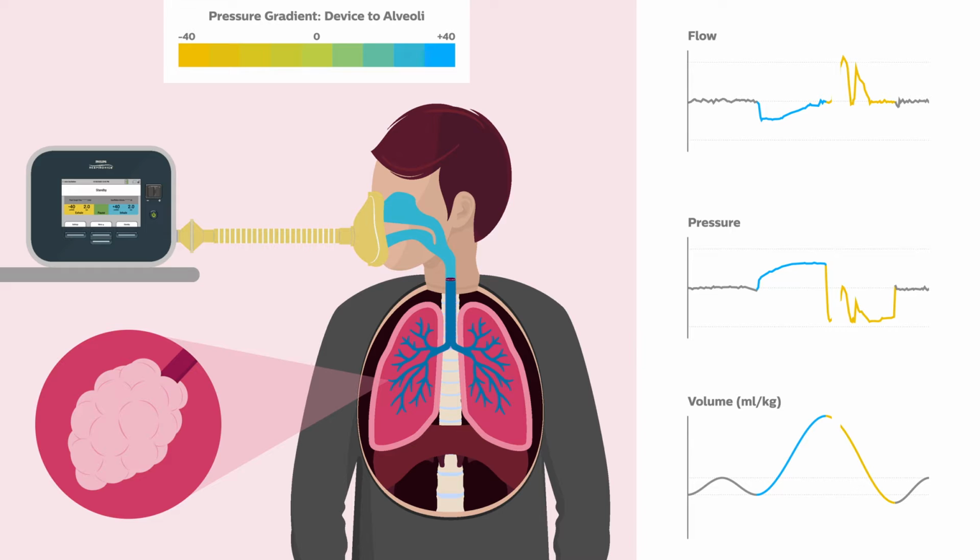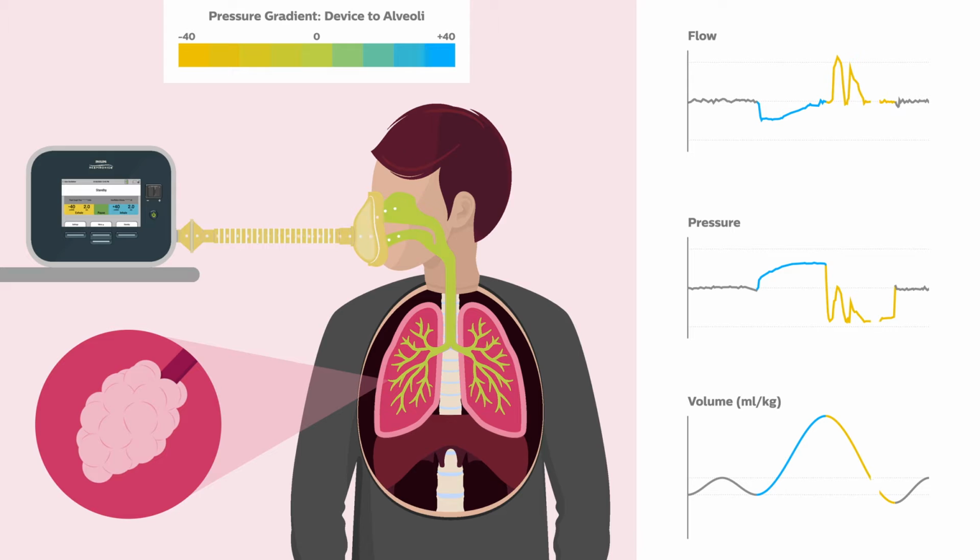A large pressure gradient along with lung recoil pressure counteracts the negative pressure and keeps the zero pressure point at the level of the mask or even into the tubing, and our point, the upper airway, remains patent in this model.